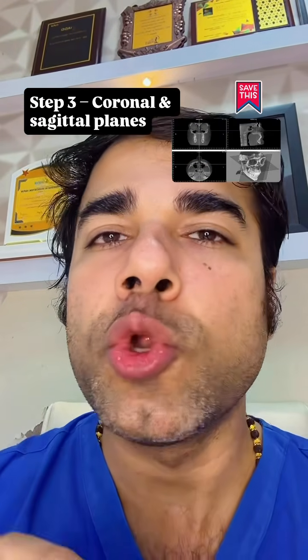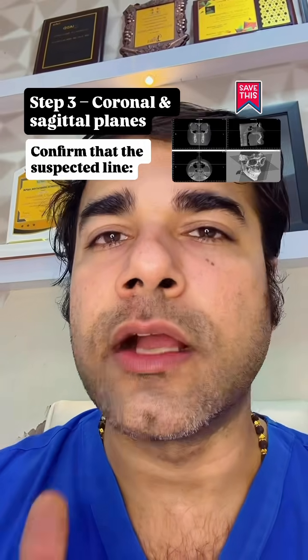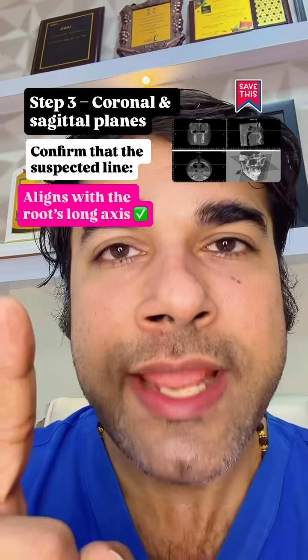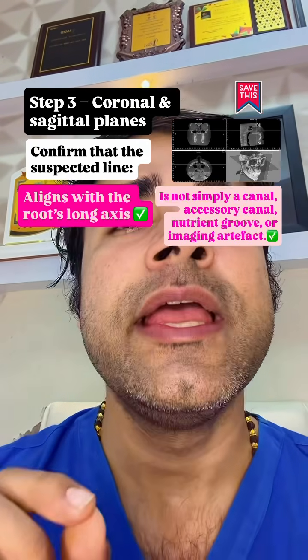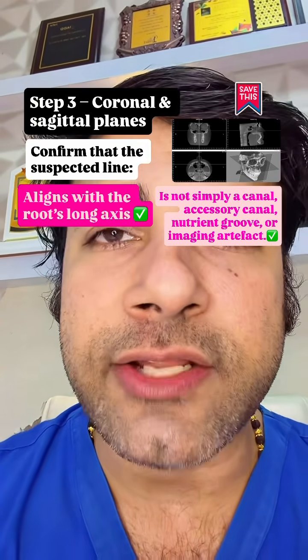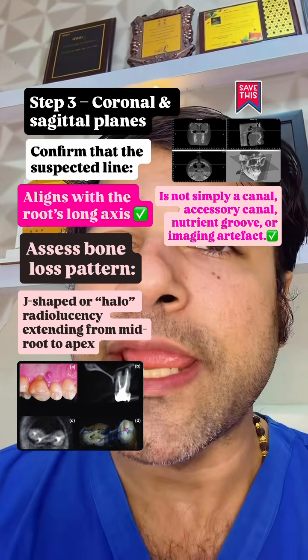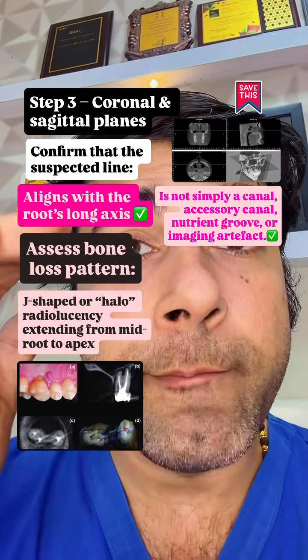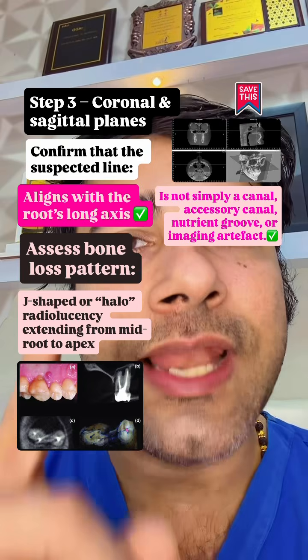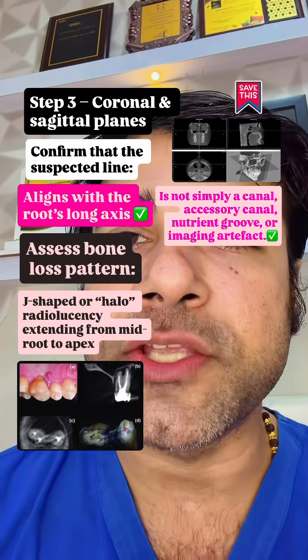Step 3. Coronal and sagittal planes. Correlate the axial findings. Confirm that the suspected line aligns with the root's long axis, is not simply a canal, accessory canal, nutrient groove or imaging artifact. Assess the bone loss pattern, J-shaped or halo radiolucency extending from the mid-root to the apex. Classic but not pathognomonic for vertical root fracture.